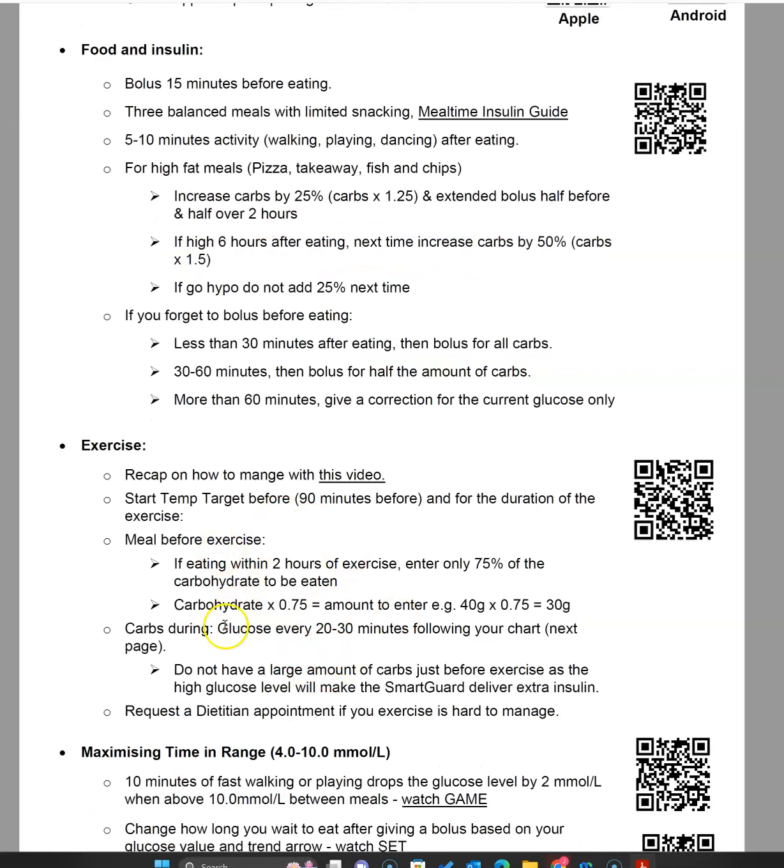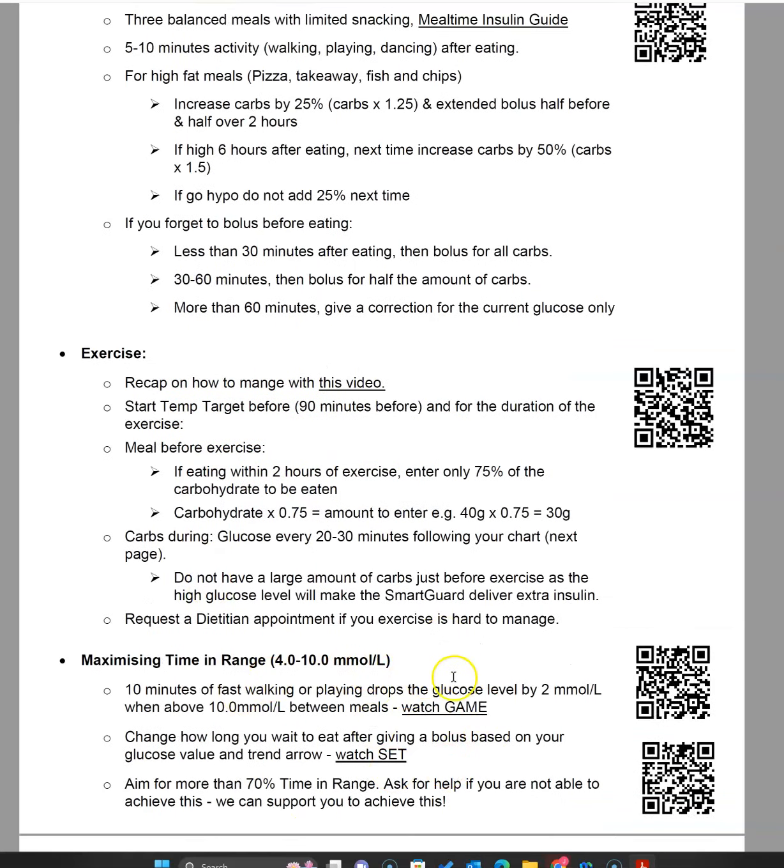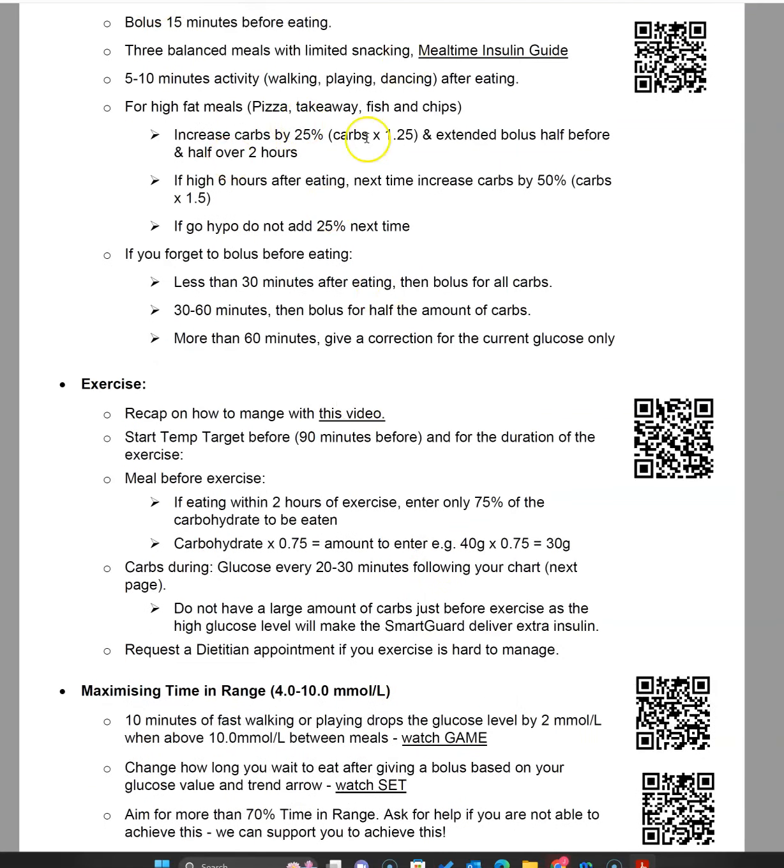And then for exercise, do they seem to be going low after certain meals? For example, after school or after lunchtime at school, they could potentially need to be reducing the carbs entered by 25% or putting the exercise mode on, for example. And then obviously they can use activities, lower highs and extra bits and pieces, but essentially, are they following the basics, and are they following the food information properly in terms of bolusing before meals? All things important to check as we go through the download.